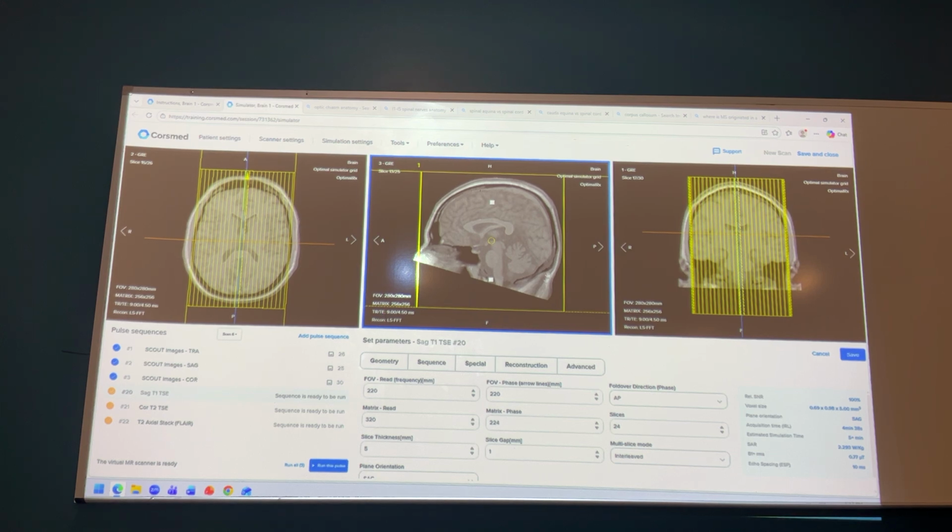So for Term 3, you gotta work with position, means everything is already planned for you. For next term, these are all gone and you have to do everything from scratch. But for now, I'm gonna tell you what to do. So, first of all, we gotta pay attention to your FOV box. This box right here is your FOV box, field of view.